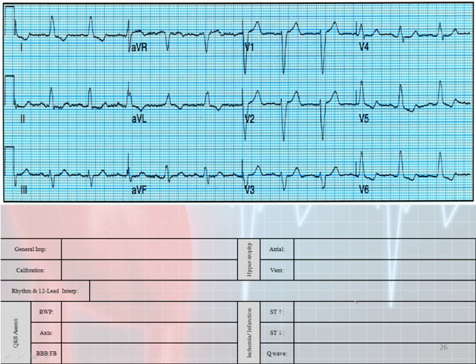Now let's look at our next 12 lead here. If we look at it, the first thing I see is that it looks wide. Calibration, my calibration markers over here on the left side are going to be standard. My rhythm interpretation, kind of an erratic baseline there. Here's some clean baseline in V2 and V3. Looks like I have P waves that are married to the QRS complexes.